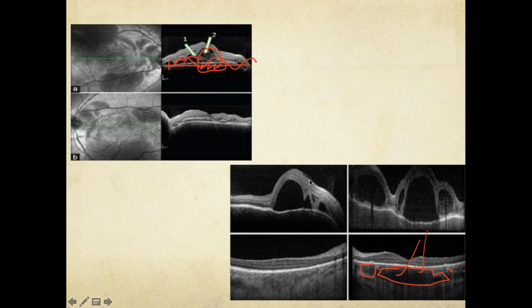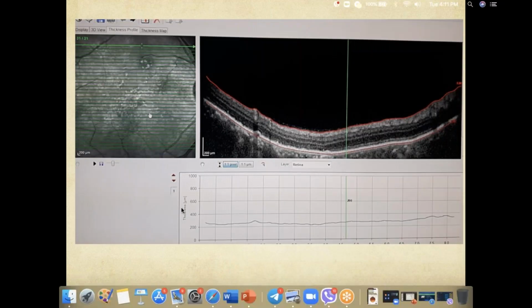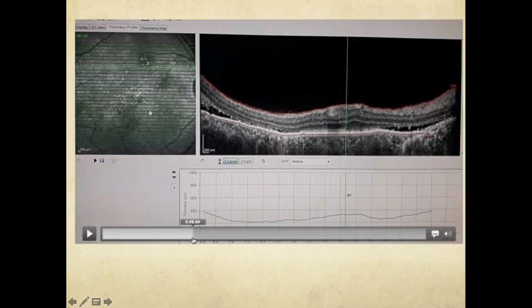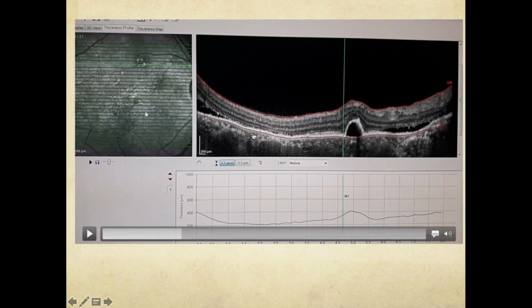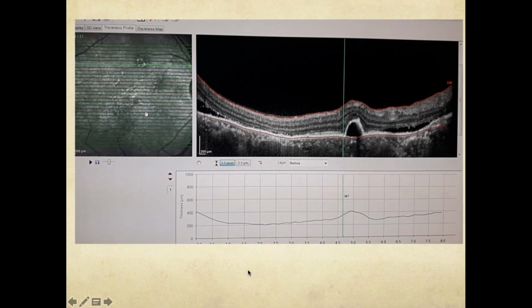This was a PCV, or polypoidal choroidal vasculopathy. Same thing, lots of uveitis, lots of CSCR, right? Then PED. The choroid is also disturbed. So this could be either, if there is a history of trauma, sympathetic ophthalmia, no history of trauma, it's a VKH. Now, the other most common diagnosis to distinguish VKH and sympathetic ophthalmia, besides the history, is to rule out ocular tuberculosis.